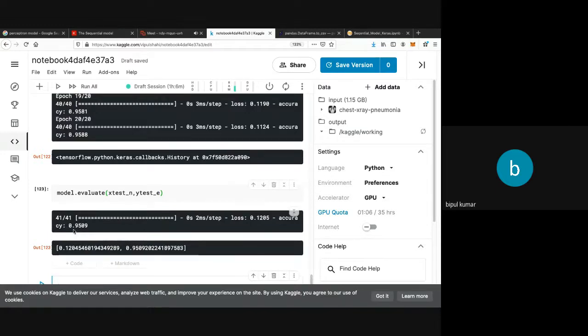95. So you can see with the dropout this time I controlled overfitting. I increased the accuracy as well, from 94% it goes to 95%. So I increased the accuracy as well as controlled the overfitting by using dropout over here. Correct. What other things can we use?